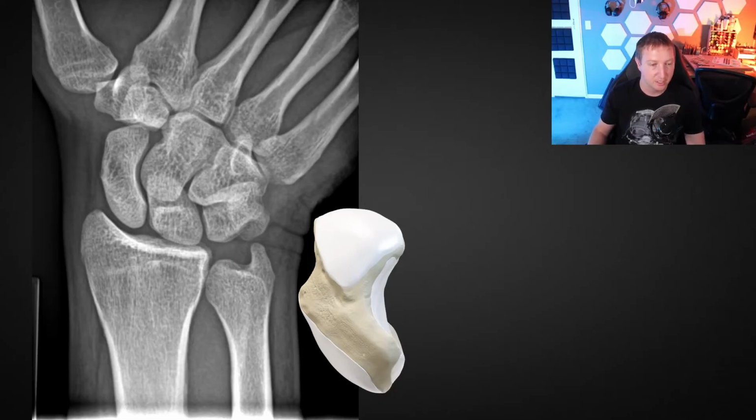Okay. And again, we'll follow down the main sclerotic portion of the articular surface, and we're measuring right from the edge of the sigmoid notch. So the edge of the sigmoid notch is here. So we draw that across and then compare that to the surface of the ulna. So that's how we're going to measure that ulnar variance.